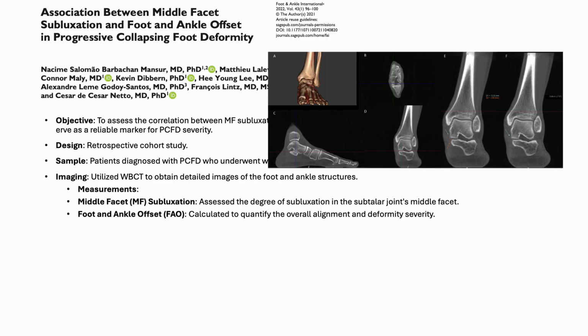Here's a weight-bearing CT scan. They're looking again at that middle facet and seeing if it's subluxation.